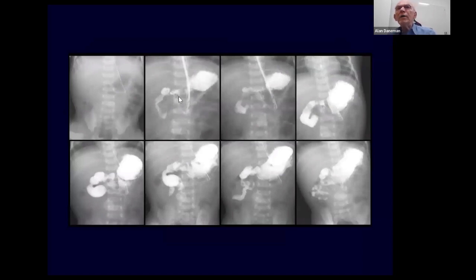Here is an upper GI where you see the abdomen has a completely benign looking, non-obstructive appearance, and yet the baby is vomiting bile. Contrast injected comes through into the duodenum, not dilated, and slowly as more comes in, it gets more dilated, emphasizing that the duodenal dilatation is intermittent. Here it comes to a complete halt, where the Ladd's bands are obstructing the duodenum and then starts to trickle through. And as it trickles through, it's on the right side, and the duodenum becomes less distended again. So duodenal distension is intermittent, and eventually it gets through and it's on the right and not on the left.